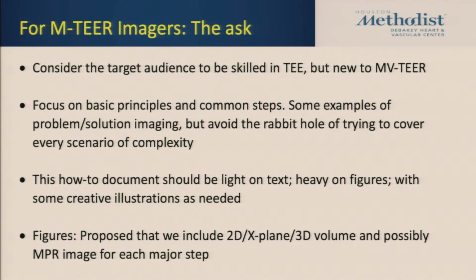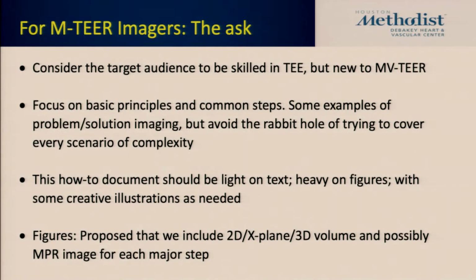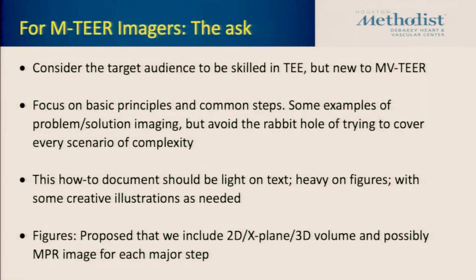So this is a document being written for people who are skilled in TEE, but don't necessarily know how to do a mitral TEER. So that's kind of the audience. You're not learning the basics of TEE in this case. You have to have some TEE skill set. Basic principles and common steps. We're going to avoid all of the possible complications of how to manage everything. Basic principles is really the focus. It's a how-to, lots of figures and light on text. And then really the integration of X-plane, 3D, and that's kind of why I'm showing it to you today.